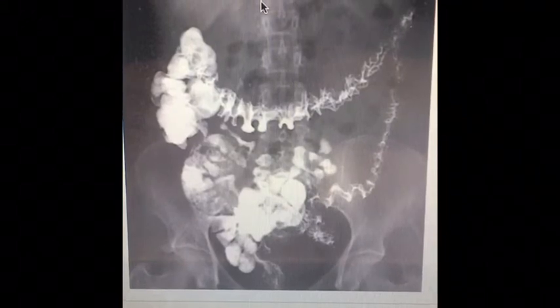From our left oblique, we will go into our left lateral decubitus position, shot PA. This will once again demonstrate air levels within the colon. We will now see air within the medial side of the descending colon and air rise to the lateral side of the ascending colon. Our last image is the post-evac.